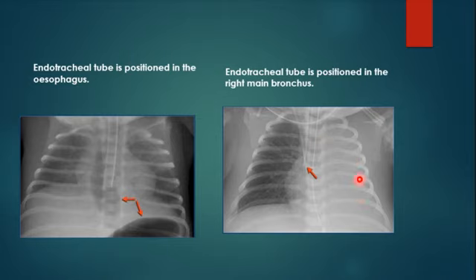So in this condition, just by recognizing it, it's life-saving. They just pull the tube 1 or 2 centimeters, air enters into the left lung, with complete resolution of the opacification and a fully functioning left lung. So your report is life-saving in cases like that. Okay.